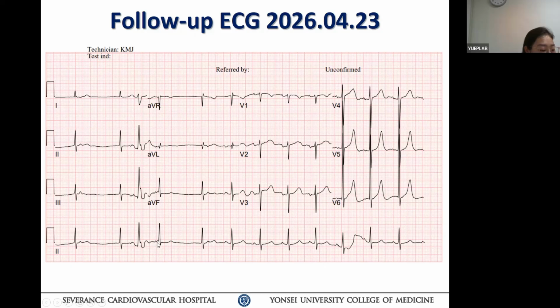This is definitely a focal ectopic P wave, not a sinus P wave. I'm not sure why this falls perfectly in line with the sinus rhythm, because this is likely a junctional escape, and so I would have expected a different rate. So I'm not sure.